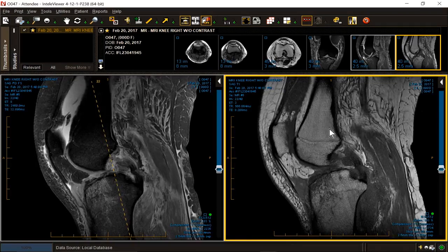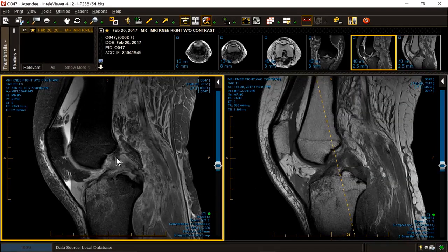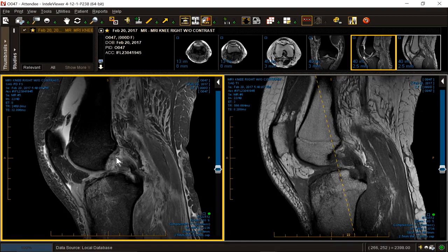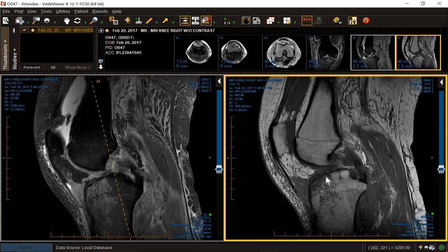Let's go right to our PCL. So our PCL is torn from the femoral end. Now, femoral end PCL tears are usually more heinous and more ominous than tibial ones. If you have a tibial avulsion, the only time you operate on it is if it has taken a piece of bone with it and you come at it from the back and you put a screw in it. Otherwise, they're left alone. So this is a nasty sign that more is going on.